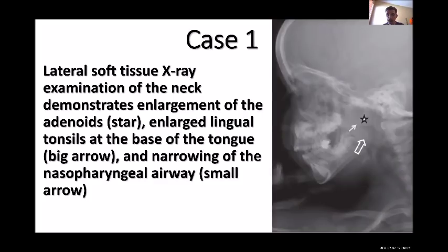It's up, it's not epiglottis, it's not below the jaw, and it's not related to the vertebral column, so it's not epiglottitis or pharyngeal tissue involvement. But there are enlarged lingual tonsils and a big tongue, and the nasopharyngeal airway is actually very tiny, and that's the reason for the difficulty in breathing and fever.